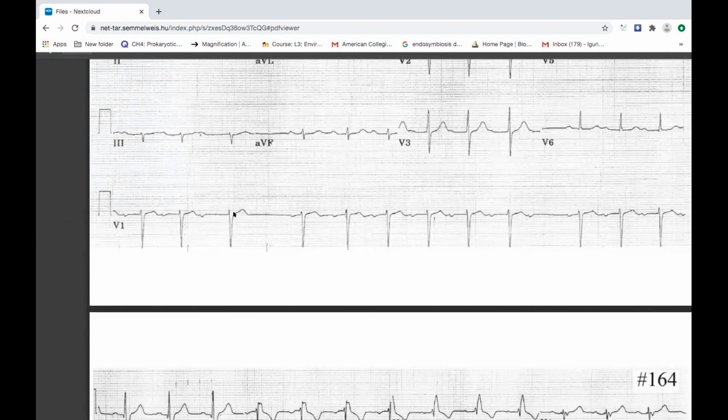Yes. But this is the QRS complex. Here you have a P and no QRS complex. Here I said P is inside the QRS complex. And this is why I said this is another bit. So that bit is possibly an escape bit. Escape bit, okay.